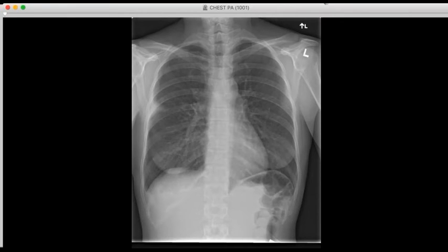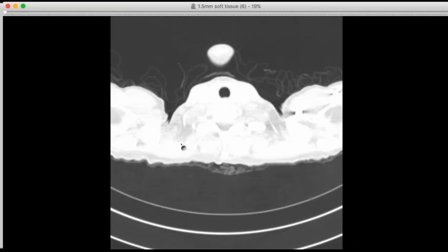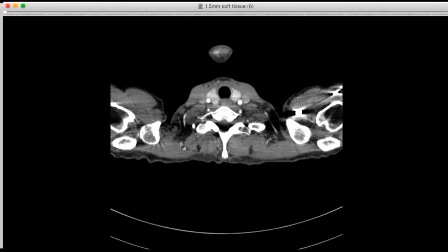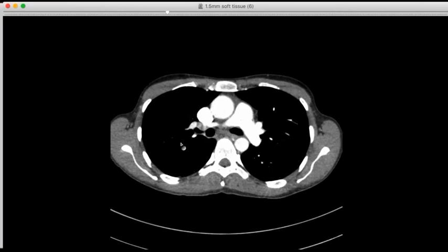Okay. So this is a young woman who presented with chest pain. And you can see there's a peripheral wedge-shaped area of consolidation here in the right upper lobe, and a very small pleural effusion. And so obviously with that history, you'd wonder about a pulmonary infarct, could be developing infection, something like that. She did have a CT angio at the time, and this is about 3 years ago. And what we see, actually a couple of findings.